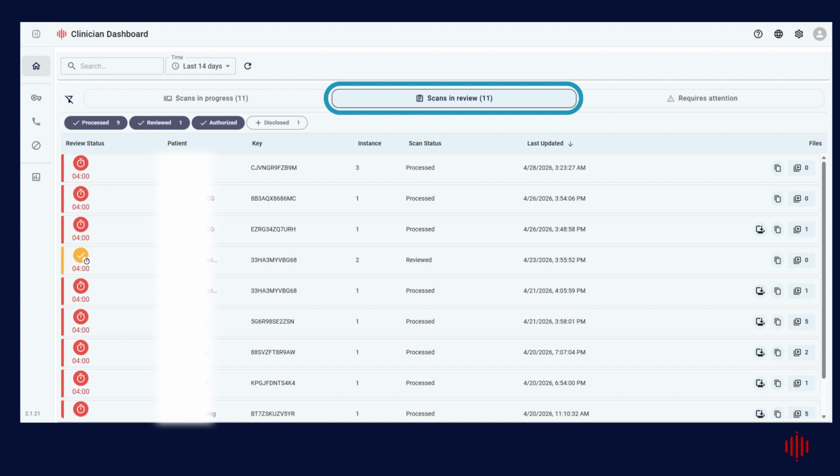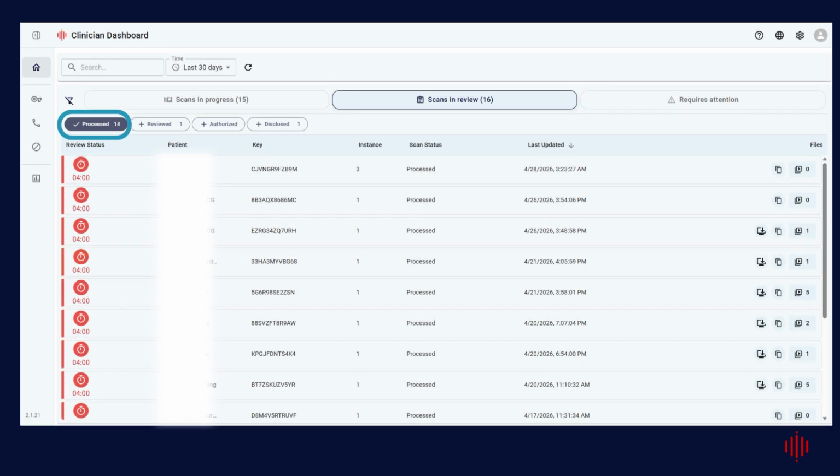All uploaded scans are automatically processed. This normally takes approximately 10 minutes. Scans that have completed the processing stage await your assessment. To streamline the efficiency of the assessment process, we have developed a multi-user workflow like common practices, where a sonographer gives the initial assessment and a physician will perform the approval and disclosure. This workflow is configurable to suit your organization.